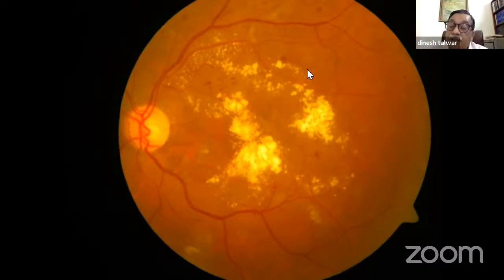It is also lipid-filled macrophages. Right. So this is lipid. Macrophages will engulf lipid later on. And why does the lipid come there? Because there's plasma. What is retinal edema? It's fluid which has come into the extracellular spaces. When it is reabsorbed, the lipids get stuck there, and those lipids will then get engulfed by macrophages before they can go. That lipid is what is there as hard exudates.